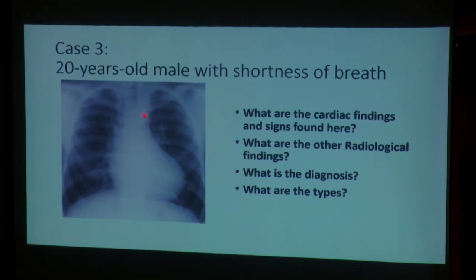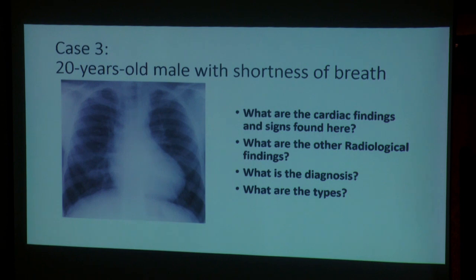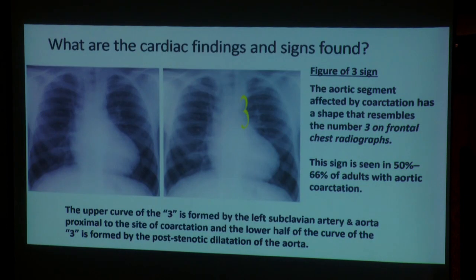See the aortic contour, is that fine or is there any abnormality? Okay. You see a figure of 3 appearance. There is a slight indentation in the aortic contour. In the aortic arch contour, there is a slight focal indentation. It's a classical figure of 3 appearance.